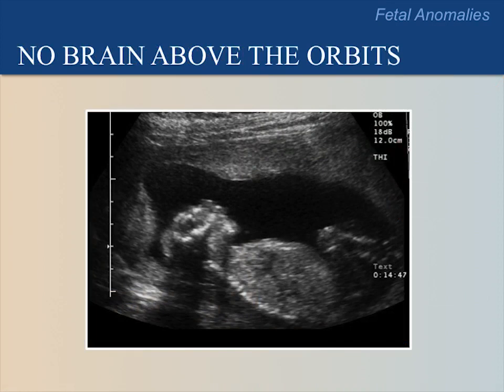This is another example of a fetus in profile with anencephaly. Please pause the video now to identify the fetal body, face, and eye. Here we have labeled the eye socket or orbit, which appears more prominent than usual, meaning that it stands out.